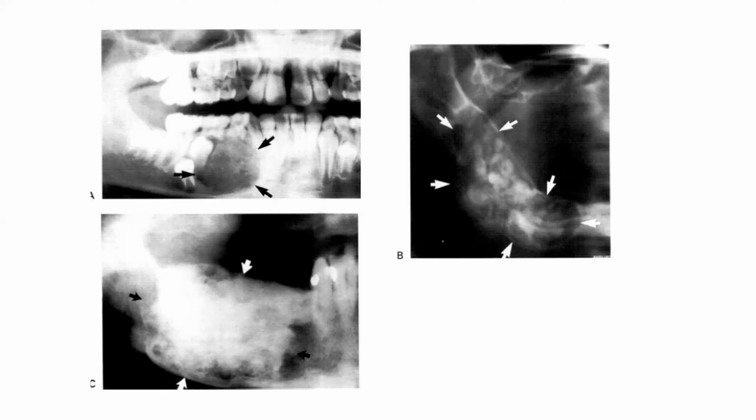Size is variable, but it may grow to several centimeters in diameter and cause facial asymmetry. It is round in shape, as presented in the X-ray marked A, and monolocular. Outline is smooth and well-defined. When opaque, usually surrounded by a thin encapsulated radiolucent line, usually corticated and circumscribed.